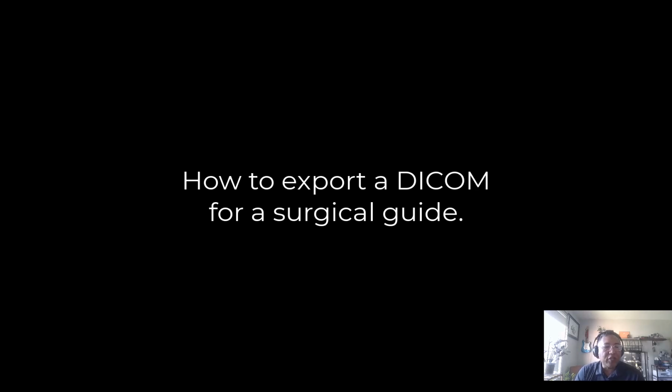Hi everyone, I want to show you how we can quickly export a CBCT scan in DICOM format to be imported into any third-party surgical guide software, such as BlueSky Bio, Glidewell, CCAT, whatever you want to do. In this demonstration, I'm going to show you how we do it in BlueSky Bio.